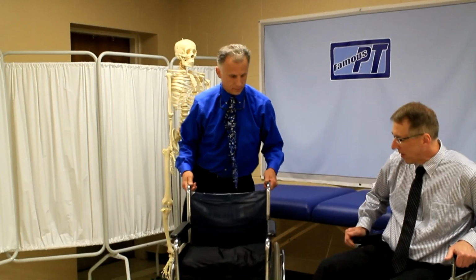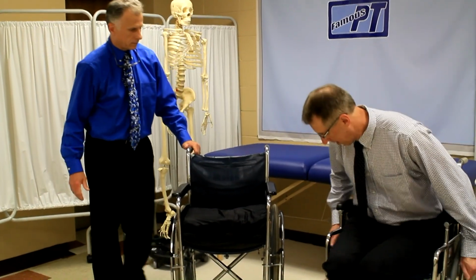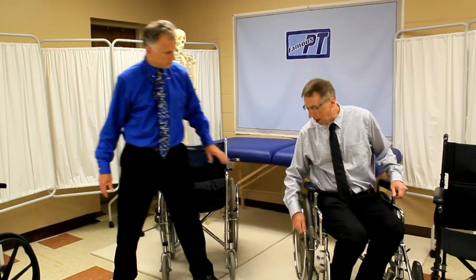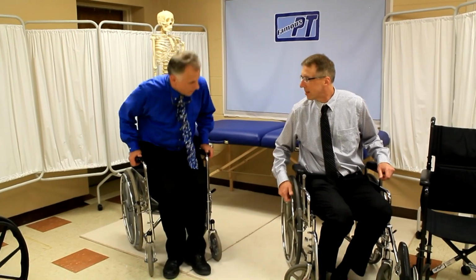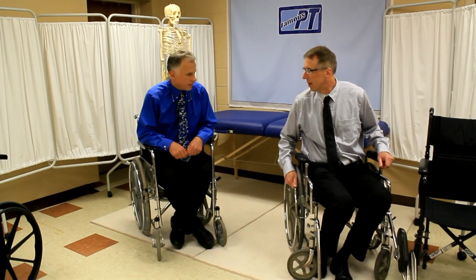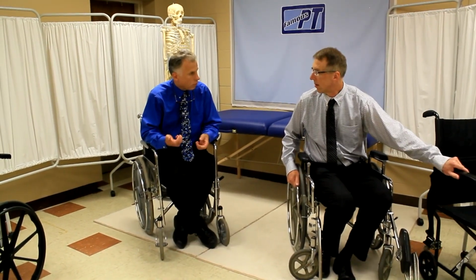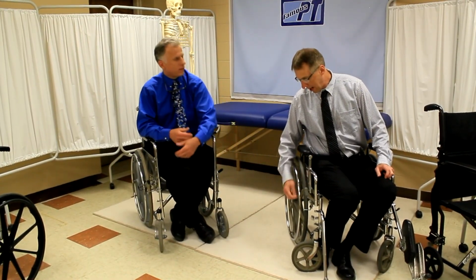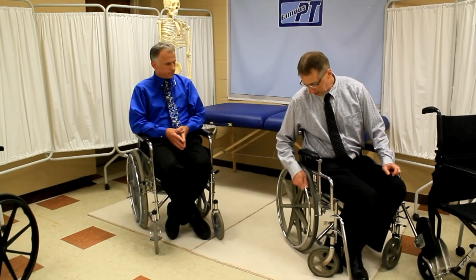All right, just one thing about propelling a chair, Brad. Normally you're grabbing on the rims. We used to even put some rubber on here. Do you remember that? Some of them used to come coated too, I believe. I've done it with people with poor grip from a stroke or whatever it may be, and you wrap spiral rubber on the rim.